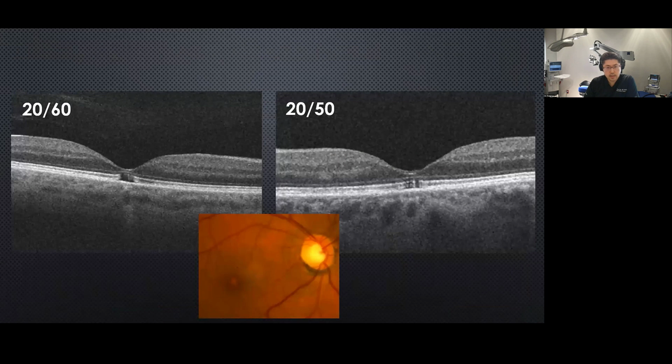As we will see in this case, a 45-year-old gentleman who came from Barbados complained that he's had many years of poor vision, and you can see on OCT there's bilateral disruption of the outer retinal layer and disruption of the ellipsoid layer, causing some hypertransmission. And then this photo shows a little yellow dot. So, what's your differential diagnosis?